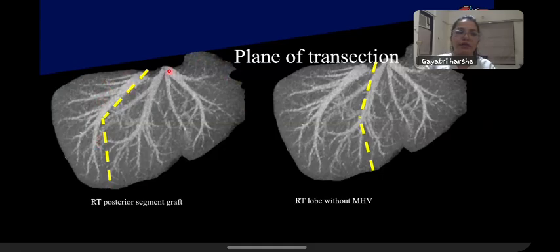then this will be the future liver remnant. Now this is a right lobe without MHV graft. So this is a line of demarcation. This is the gallbladder fossa line, and we go above up to the confluence of, this is segment 5 and this is segment 4. This is most important because if you can't identify the segmental veins, you can't resect the margins.